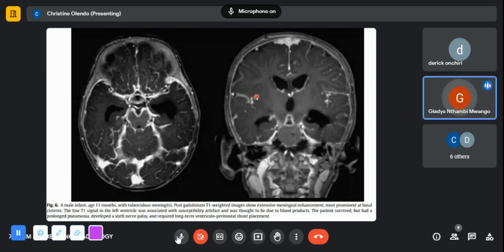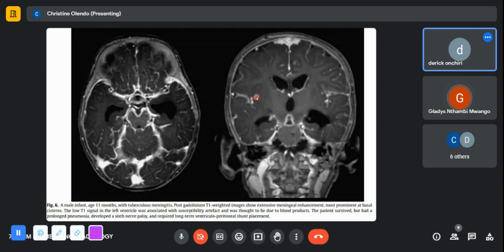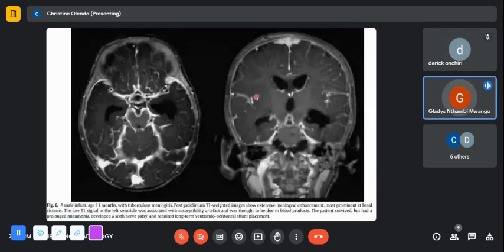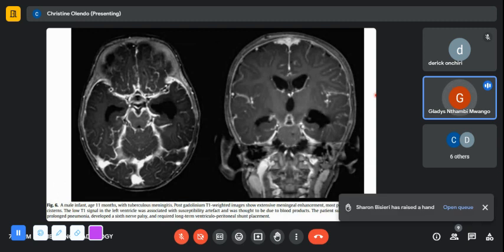So these are really very nice images. Would we term it as a meningeal carcinomatosis? That description, no. This is not carcinomatous. This looks more of granulomas. It's diffuse, they're small, they're punctate, and there's no history of cancer. The patient is coming with features of meningitis and fevers, and maybe even history of contact with TB.